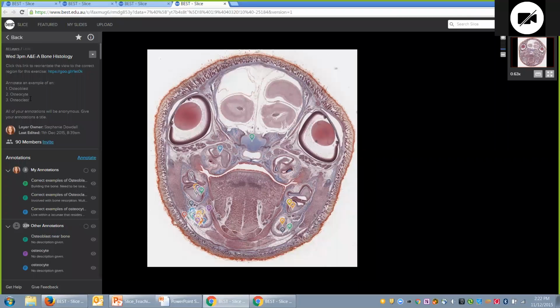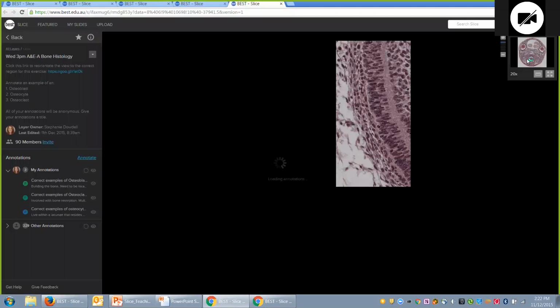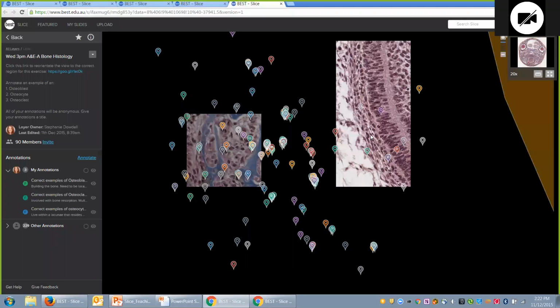And this is after they attended a lecture on bone histology. So when they were invited, they came to this zoomed out view, and Patrick de Pimentio gave them a bit of background about what they were seeing, and then they were invited to click this link. So the slide reloaded at a higher zoom level. So now you can see up in this region here, we're down here.